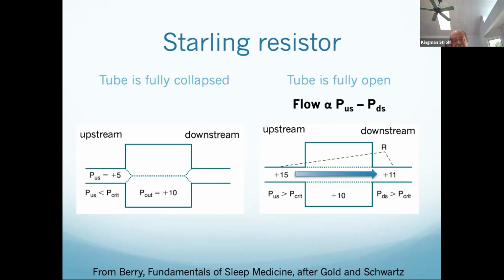Now on the next example. Right, so if you look at this one, the pressure goes down by 4 as it goes along this airway.